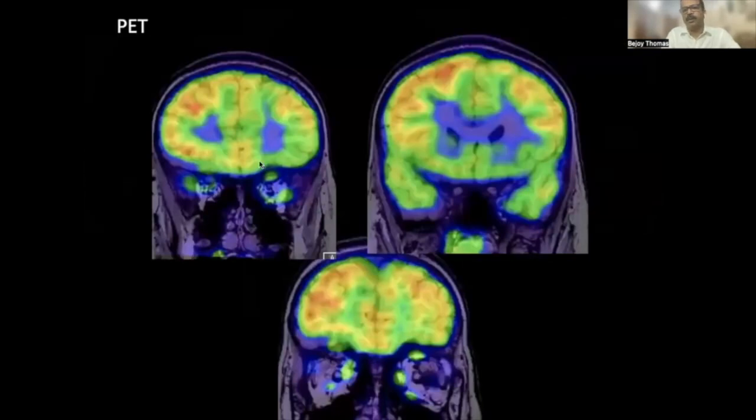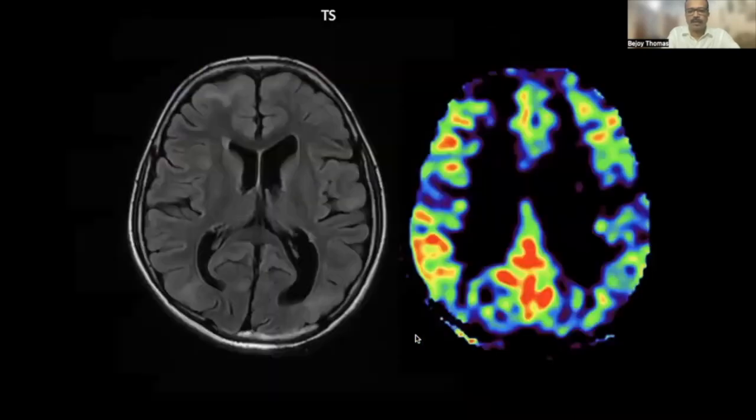That is actually looking at the metabolism. There is a corresponding perfusion deficit, and SPECT correlates more with the ASL imaging as far as perfusion is concerned. But the PET image is also showing interictal metabolism, so there is a coupling of perfusion and metabolism, and you can see there is corresponding hypometabolism in the PET imaging as well. This is a case of tuberous sclerosis.